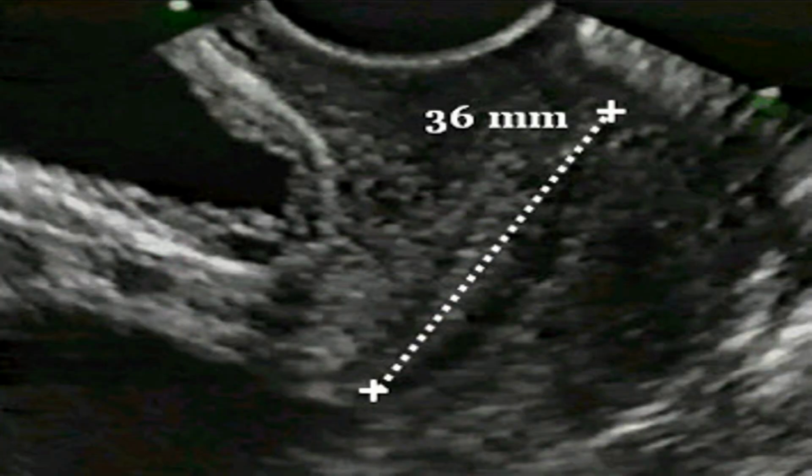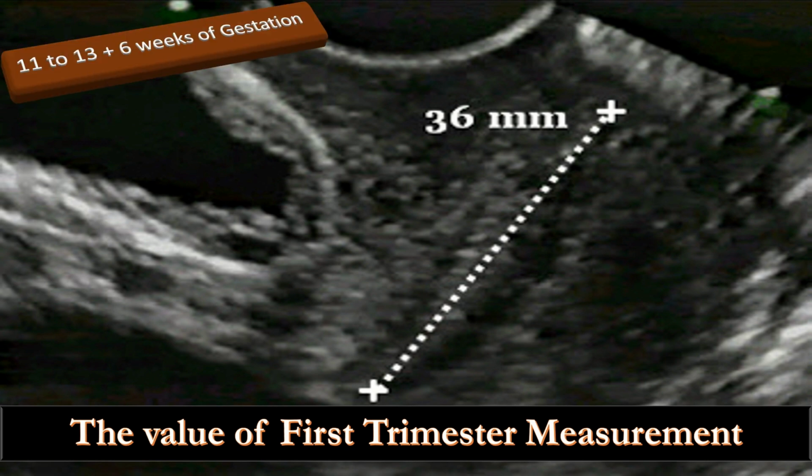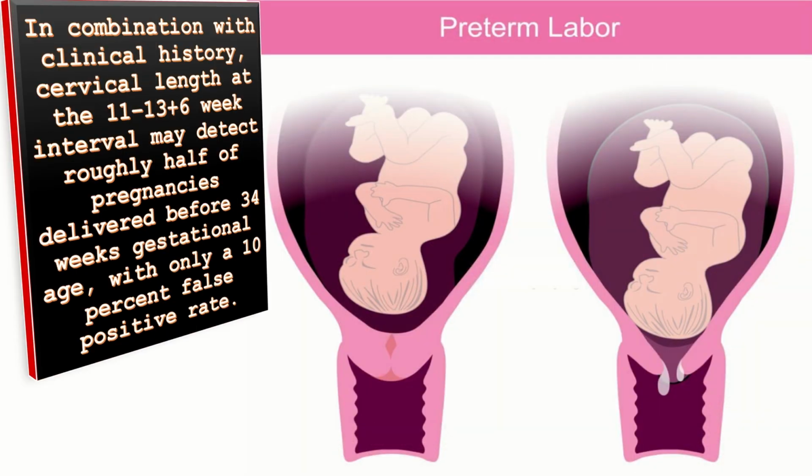Some centers argue that there may be value in performing assessment early in the gestation, during 11 to 13 plus 6 weeks, for the same purpose of evaluating the risk of preterm birth. In combination with a clinical history, cervical length at the 11 to 13 plus 6 weeks interval may detect roughly half of the pregnancies delivered before 34 weeks of gestational age, with only 10% false positive rate.